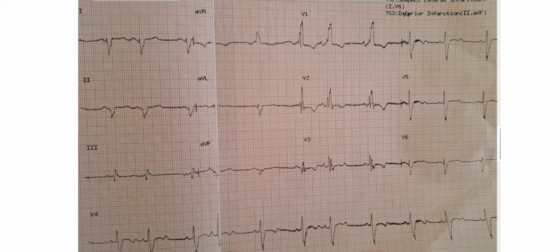So in this video guys, I want us to just go through this ECG. I hope you guys have been watching this series. It's gonna be a very long series because we want to get to the bottom of an ECG. We shouldn't be having friends of ours who are afraid of even looking at an ECG. That's the whole plan. So please watch guys, watch.